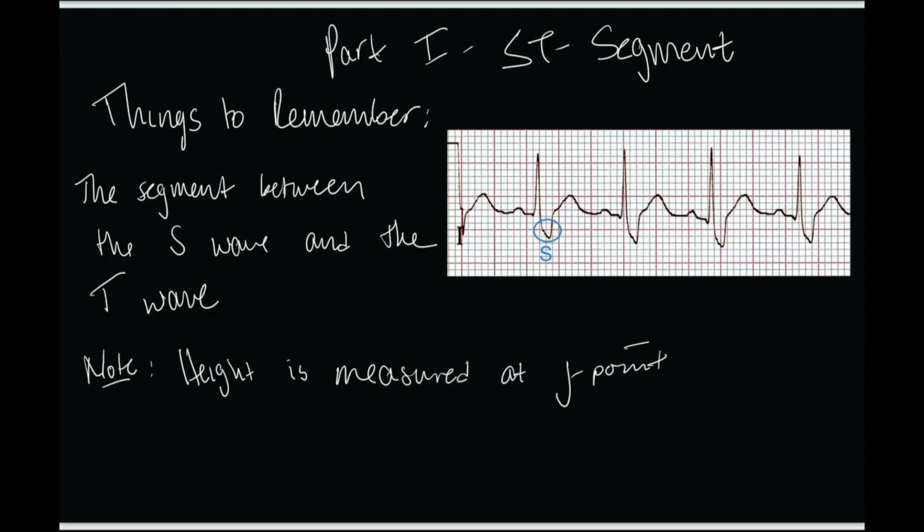All right. So if we look at our example here, we have that P wave. We have that tall positive deflection, which makes it our R wave. We have that T wave, and before the T wave, we have that negative deflection below the baseline, so we have that S wave. And we see as that S wave proceeds up, we get flat right here, which makes that our J point.